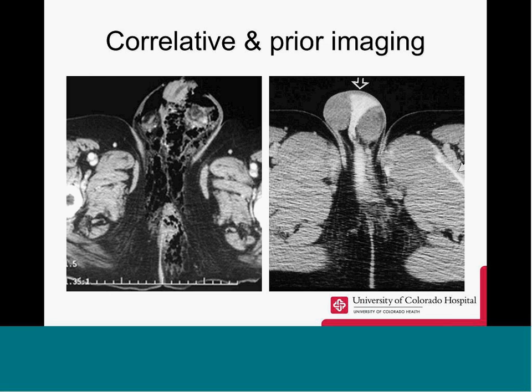Here we can see some different images. This is a necrotizing fasciitis on the left in the scrotum due to a multiple trauma injury. I'm sorry, this is the necrotizing fasciitis, and then here is the contrast in the scrotum due to a multiple trauma injury leaking from the peritoneum into the scrotum.